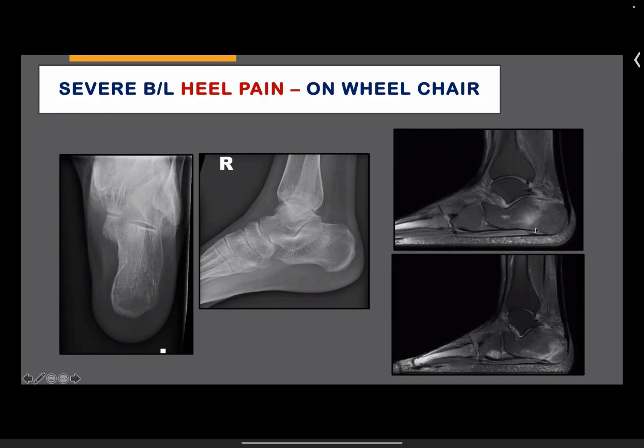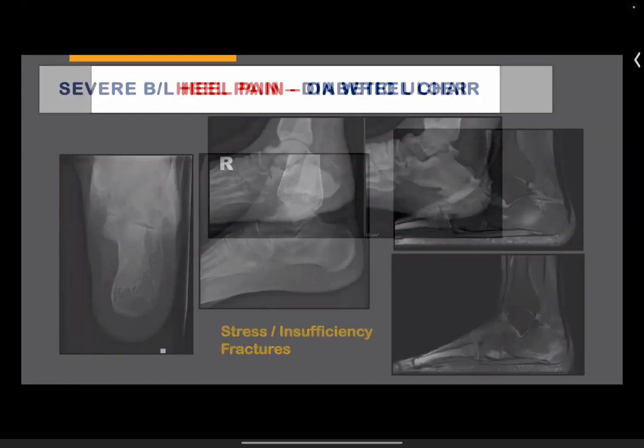So always think about fractures when there is severe pain and the patient is not able to weight-bear. People can live with fractures with normal X-rays, okay? If you go back now, you can see a bit of sclerotic band there, but it'll be tricky if you keep on calling everybody like this fractured, then we'll get probably too many MRs. But again, it's the clinician who needs to raise that. If the patient has bony tenderness and is not able to weight-bear, then you have to think about insufficiency fractures. Okay. Right. Well, this is easy.